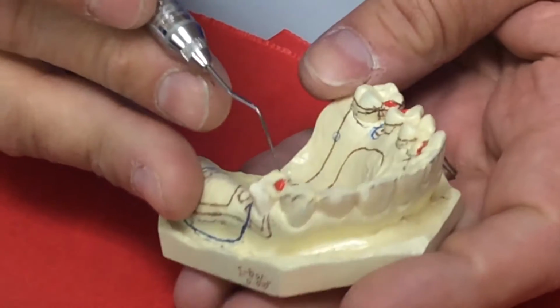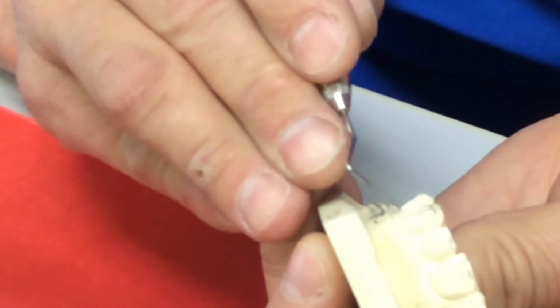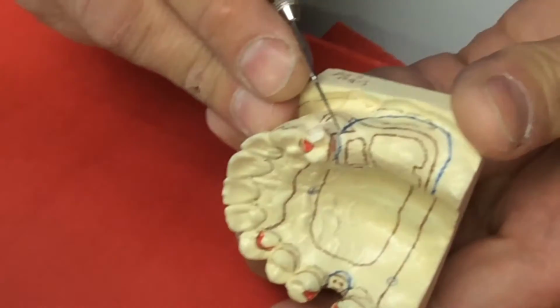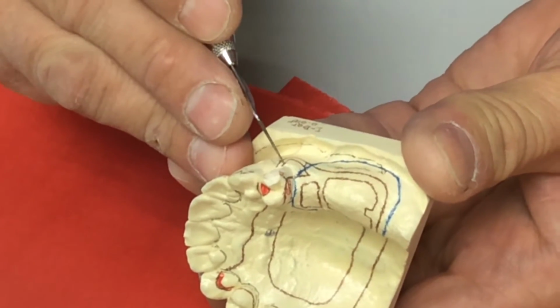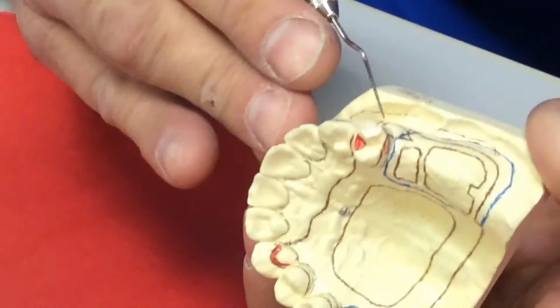So let's take a look at this. Mesial rest, distal guide plane, an I-bar. Somebody's dropped it, so the I-bar is missing now. Keep in mind that the I-bar should come up to around the mid-buccal. Never distal to the height of contour. Mid-buccal is ideal. Your I-bar should be about 1 millimeter to 1.5 millimeters wide and consistently the same width, just for the niceness of knowing how to draw it.